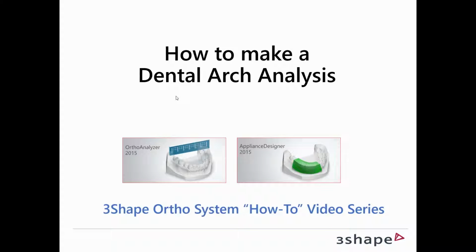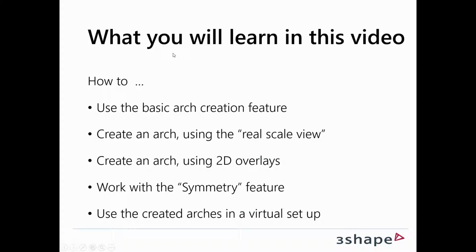Yes, hi. So what you'll learn in this video is how to use the basic arch creation feature, how to create an arch using the real scale view, how to create an arch using 2D overlays, how to work with the symmetry feature, and how to use the created arches in a virtual setup.